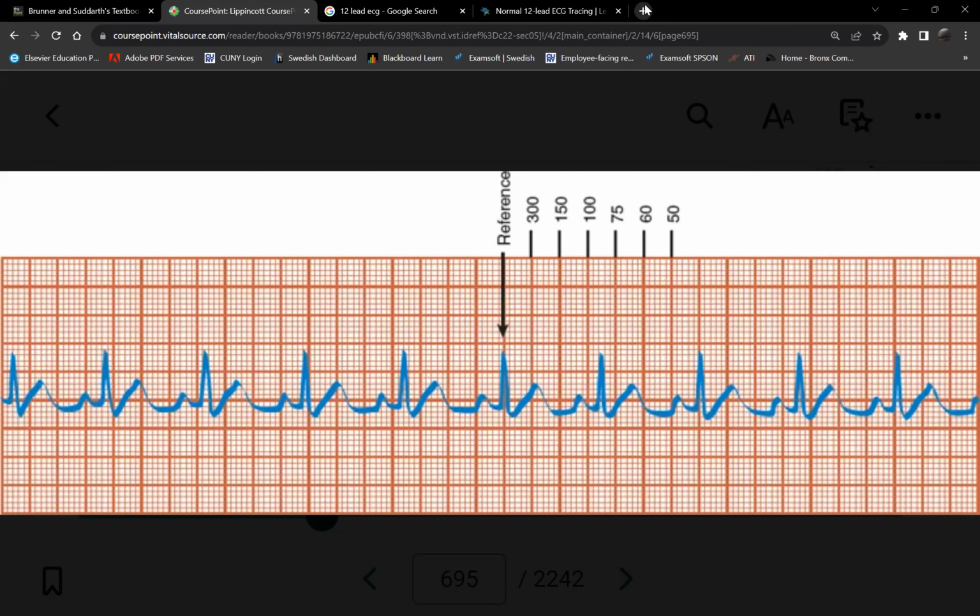If I were to pick, I would choose this R or this R. Why would I choose these 2? Because they look the same. Because they fall on a straight line. So it's easy for me. So if I count between these 2, can I count the small boxes or big boxes between these 2? Very easy.